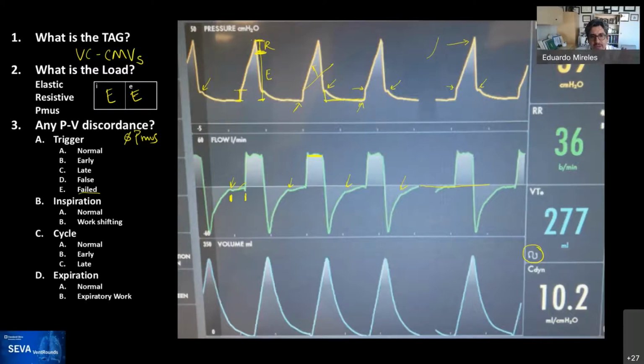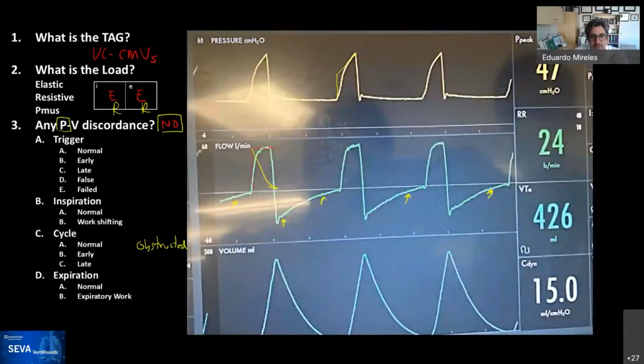It doesn't always do that, and there's two things that I see. If this comes out very high, sometimes you can see it from higher. That makes me think that the expiratory valve is not working. When I see it this low and repetitive and with nothing else, it makes me think that that's part of the algorithm. And we have seen that. I'll show you the prior one. So look at this one. And we have discussed this in the past, in which the ventilator is trying to get you back to PEEP without crossing it, or back to it the fastest. And they have created an algorithm that they put a fancy name to, to try to get you there the fastest. And sometimes it works well, sometimes it doesn't.